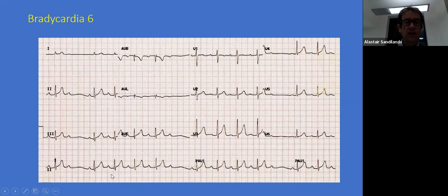What is the relationship of the P waves to the QRS? As you can see, your rhythm might be irregular. But in actual fact, if I look at this, I see some sort of pattern, and so you could say it's regularly irregular. Either way, the algorithm allows you to get to an answer, because it's difficult to say whether this is irregular or regularly irregular. It's certainly not regular on its own.